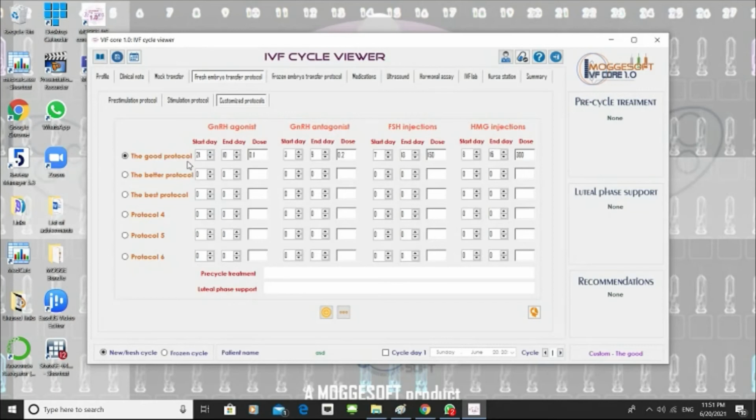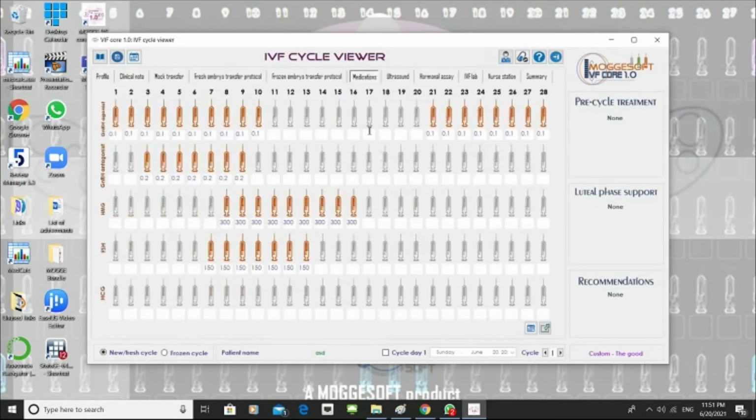So I actually wrote the start date here and the end date here, as usual. And when I click here, what's going to happen is software is understanding that I want to start in the previous cycle. So it tells you from the day 21 and then going up to the day 10. So it understands when you write it in a reverse direction, like the bigger number is first, that means that you want to start in the previous cycle. So that shows up here as well.